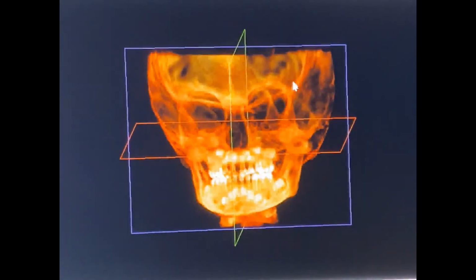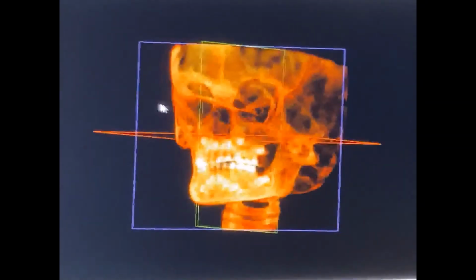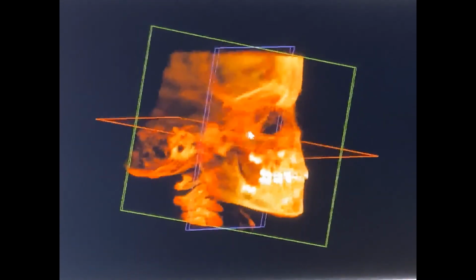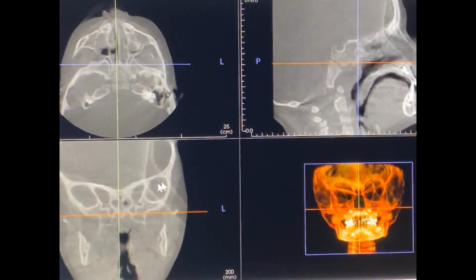But this is why kids have such big heads when they're small. And as they get to be about 9, 10 years old, this part gets bigger. And then when they're teenagers, this part gets bigger. Very, very typical. But look at how I can see the teeth, the spine, the whole face, head and neck. This is part of the game that we need to play to look at stuff. But let's get out of here, and let's look at this one.